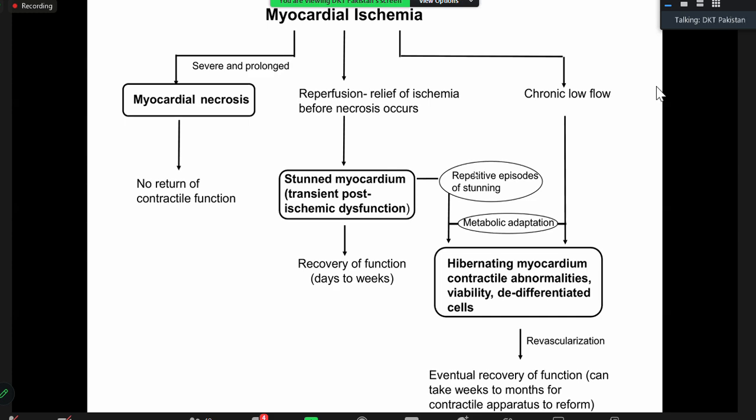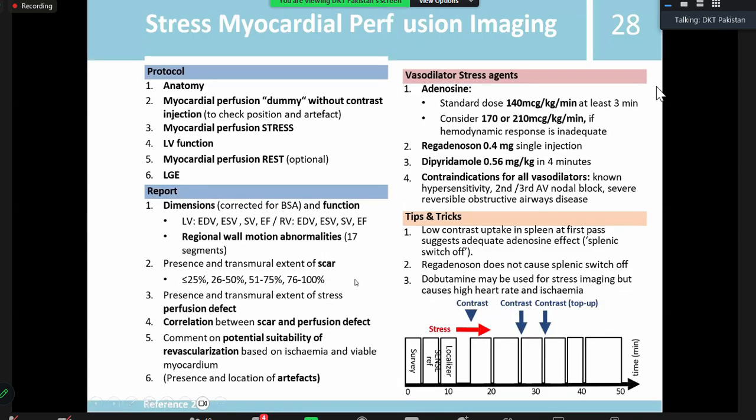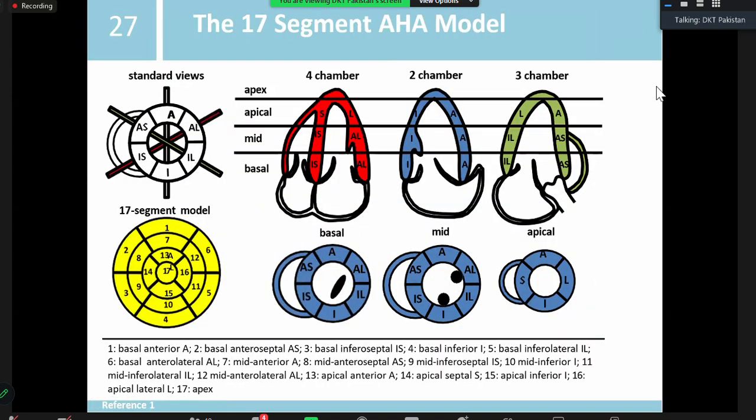Going to the heart walls again, there is the basal segment. You can see here, it is taken from the basal slice. So it is a 4-chamber view, 2-chamber view, and this is a 3-chamber view. You can see only part of the valves here. So this is a basal slice.